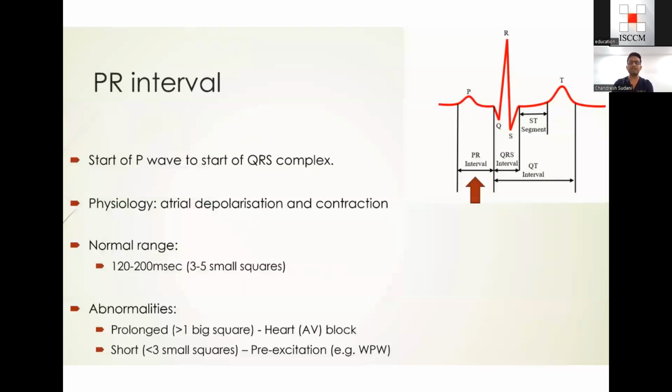Now coming to the PR interval. Remember here again how it is calculated: from the start of the P wave till the start of the QRS complex, which will be considered as a PR interval. As far as the physiology is concerned, it tells about the atrial depolarization and, at the same time, contraction.